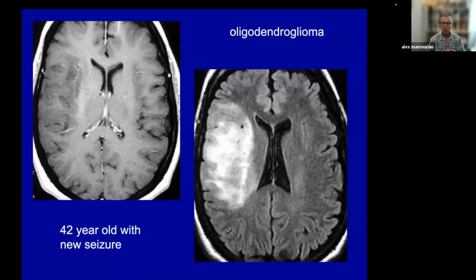And that's fine. If you have any question, just repeat the scan in about 2 months. Because with MS lesions, there should be some regression of the acute inflammatory changes over the course of 2 months, whereas with the neoplasms, particularly low-grade neoplasm, you expect it to look about the same in 2 months' time.